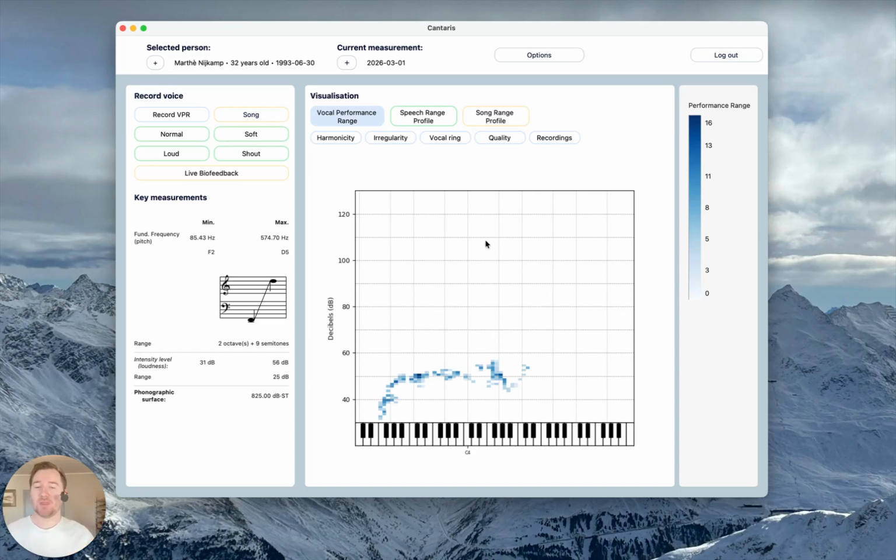In this try. Now, let's say that I warmed up my voice more and I'm just going to add a new recording to it to see if I can reach any lower, for example. Then I can just click record again and make a new recording on top of it, and it will add it to this. Now, let's say that I make a new recording, but I kind of mess up a little bit, and I don't think that this measurement belongs here. For example, something like this. Now, something happened here, and I cannot really discern it from the rest of the voice.